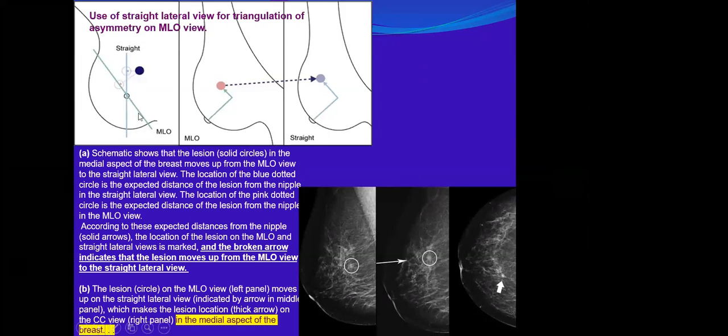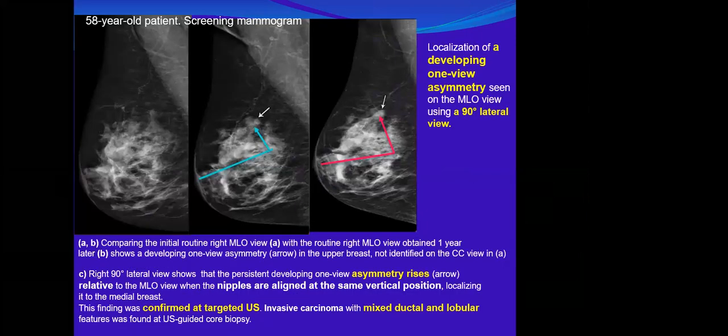This line represents the MLO, and this is the straight lateral.